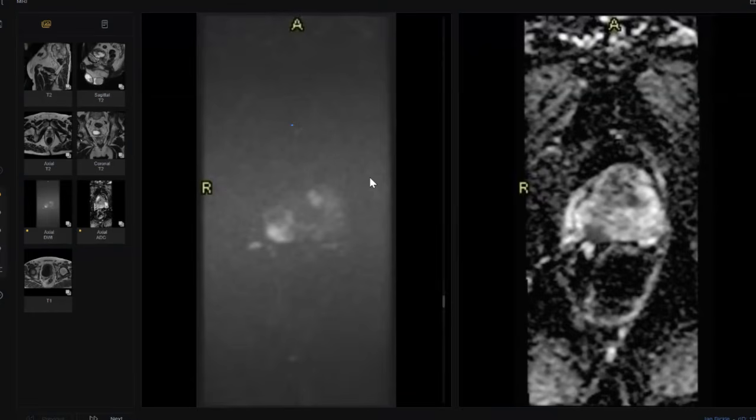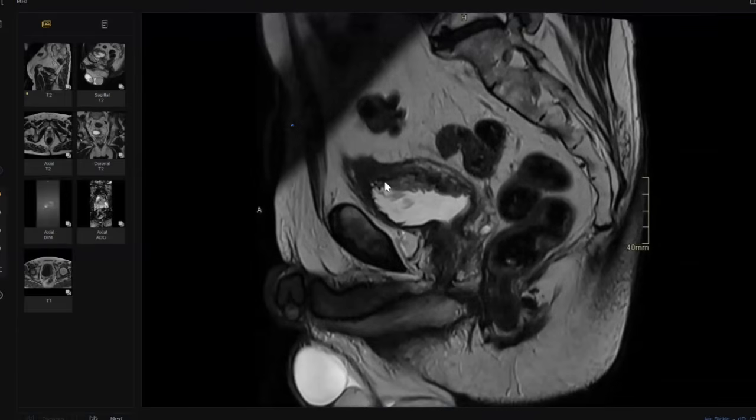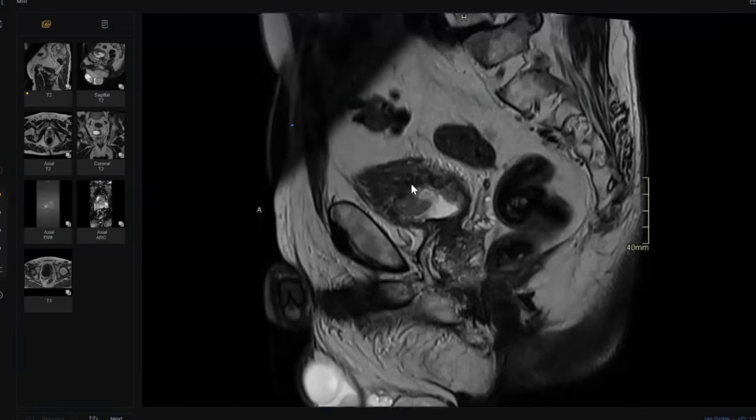Thank you. What happened in this case? The doctor, I gave her this one. I think I started with this one. She picked up this mural thickening or mass. Okay? No worry, no doubt this is a malignancy here. But the trick, leave the mouse, please, doctor. Leave the mouse. Yes, sir. The trick is here.